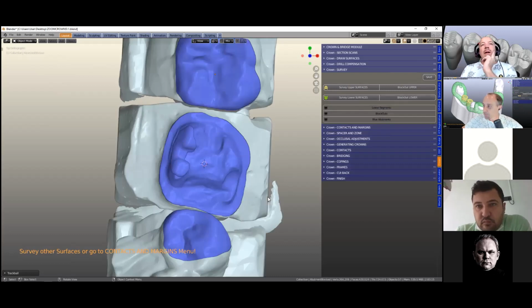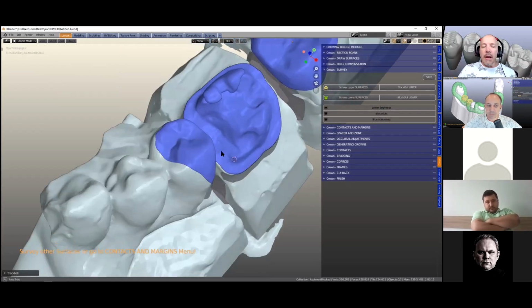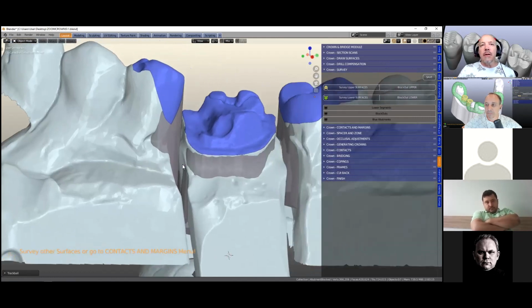Yeah, so we're blocking those out because the 4-axis milling machines are problematic. The burr can't reach in certain angles. This has been made known to us previously, because we only had a blob there. 5-axis machines, no problem. 4-axis machines, big problems with that. So we had to come up with an idea of blocking those little things out.